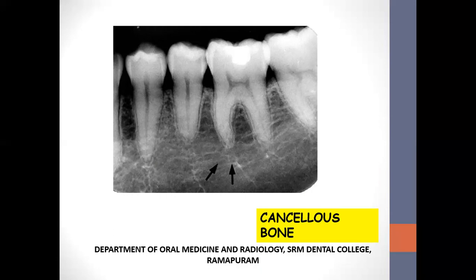The radiographic pattern of the trabeculae comes from two anatomical structures. The first is the cancellous bone itself. The second is the endosteal surface of the outer cortical bone, where the cancellous bone fuses with the cortical bone.